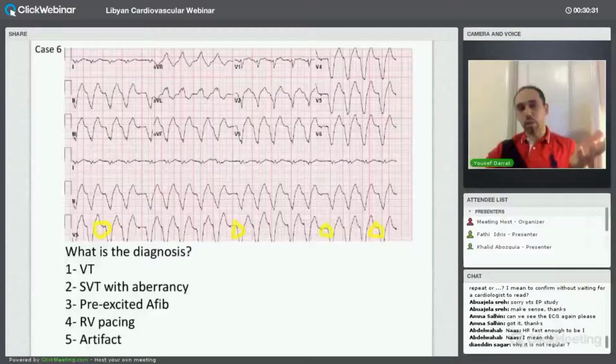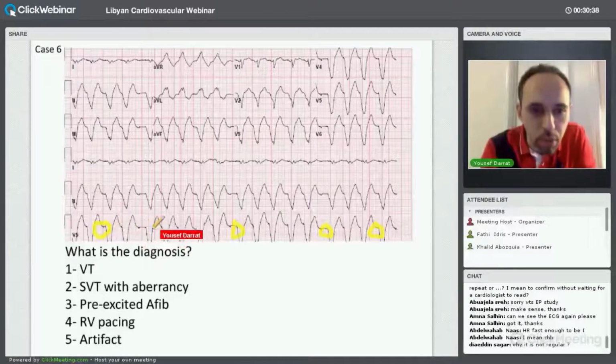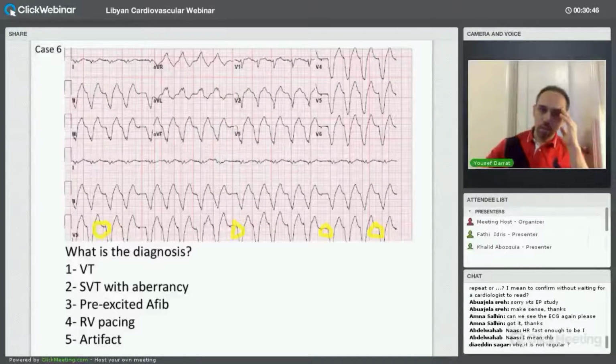So this patient has complete heart block. His heart doesn't beat on its own, so he has to track the sinus beats, and then he blocks every number of beats. So he blocks every one. So let's see, 1, 2, 3, 4, 5, 6, 7. So every 7th beat he kind of blocks. So this is called an upper rate behavior. That's why it looks irregular.